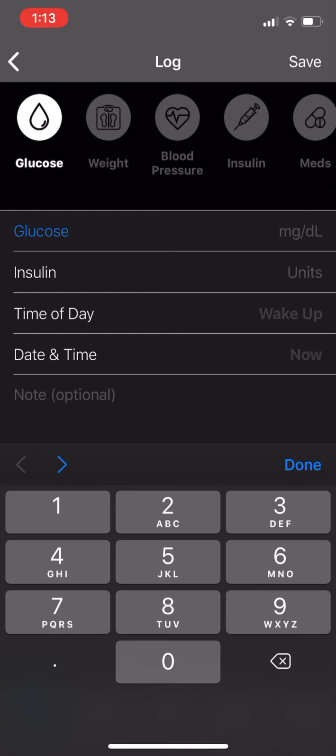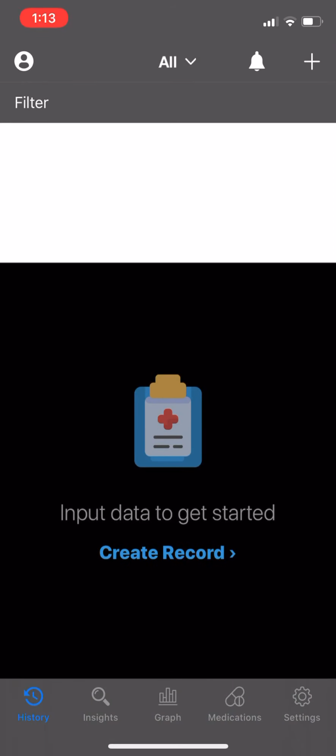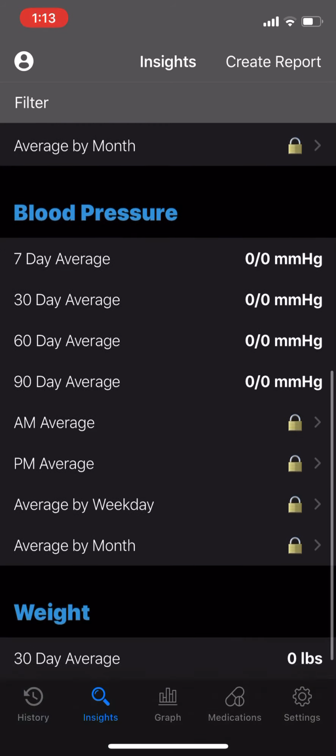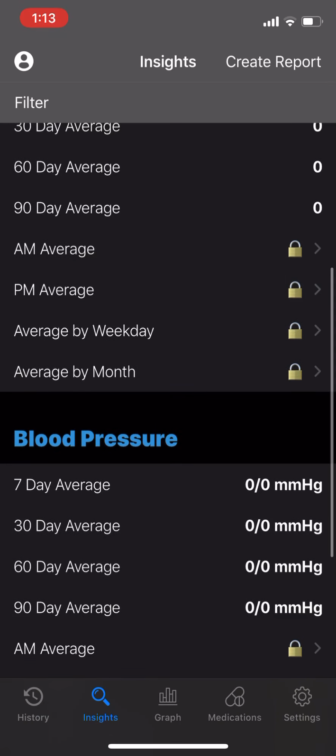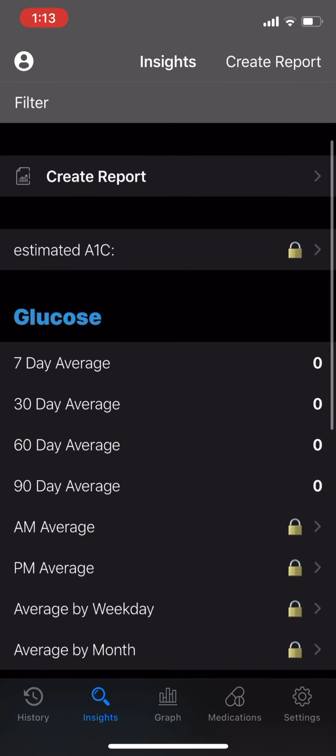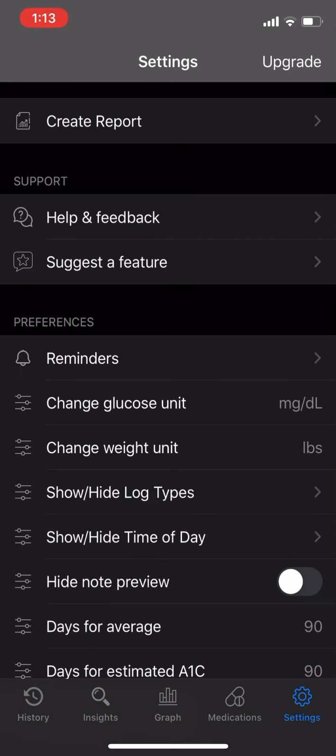The user interface, in terms of how it looks, it's this screen, I feel like that just takes away a lot of points because it is the first thing you see when you enter the app. Overall, I don't hate it. I like the headings. That's kind of just a little different, adding the blue. And it is dark mode, which I said before that I like as well. So for user interface, I'll give it a 3 out of 10.